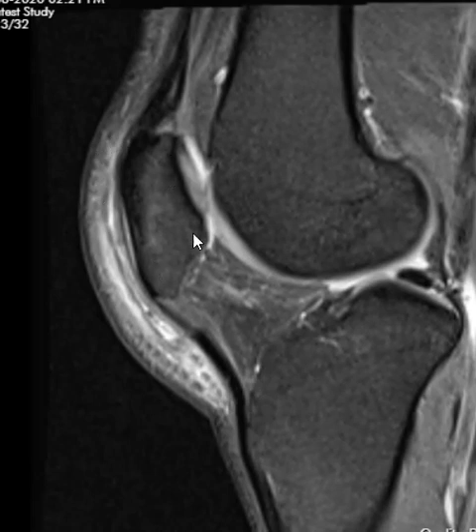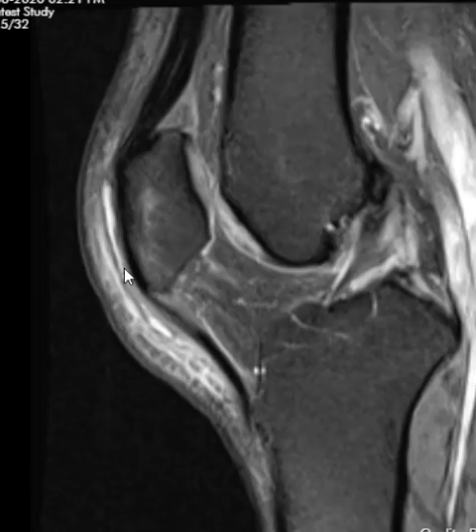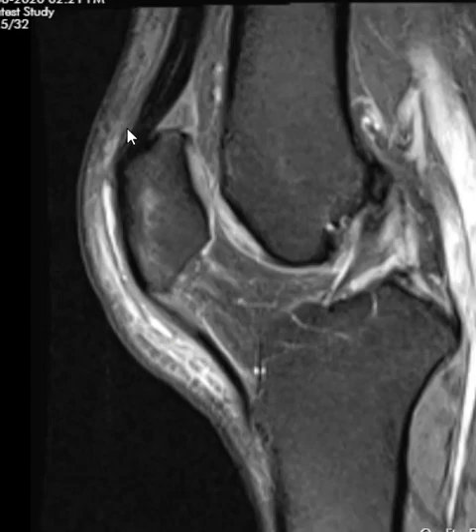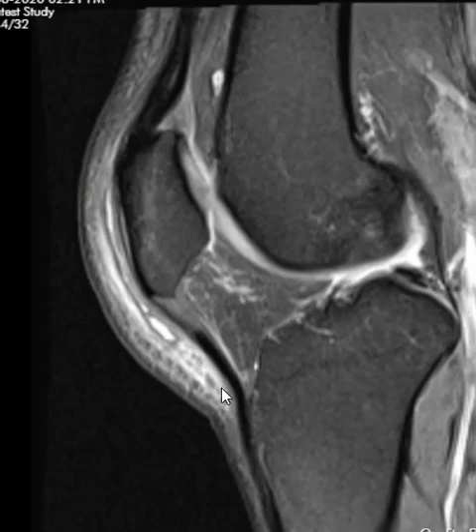This is the kneecap looking in profile. This is the femur, tibia, and you can see how swollen this is. And the really thin band of white stuff here, this is the fluid, the inflamed bursa. Again, this edema that's all around it, this more gray, is the subcutaneous soft tissue. So a nice classic example of prepatellar bursitis, inflammation in front of the kneecap.